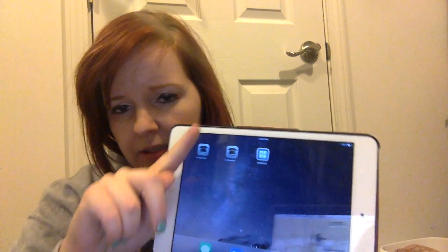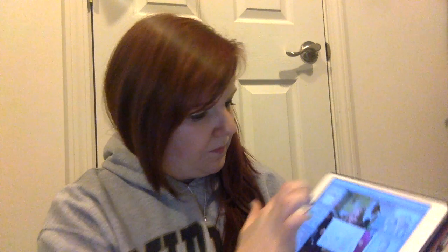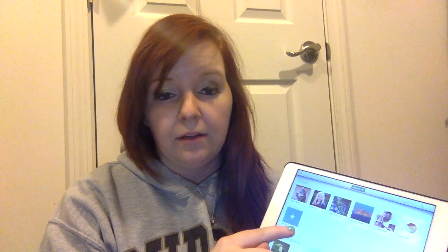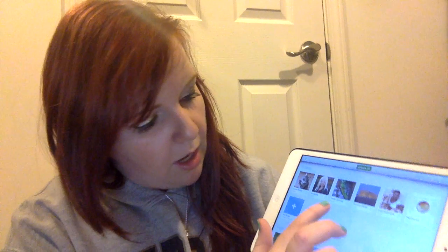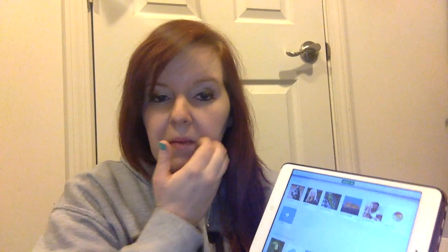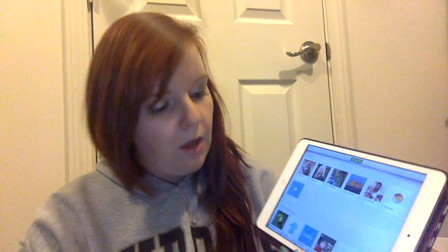I have my iPad here with me, and I downloaded the system right here called Bitsboard. It is free, but then there's also a $20 one with more gadgets and whatnot. So you'll click on the system, and it'll show up, and you have pre-downloaded boards that they have already downloaded for you. And there's ones that say action words, emotions, animals, places, and first sentences. These are all ones that you could use for tact programs. I know we use the emotions one a lot for tact programs.